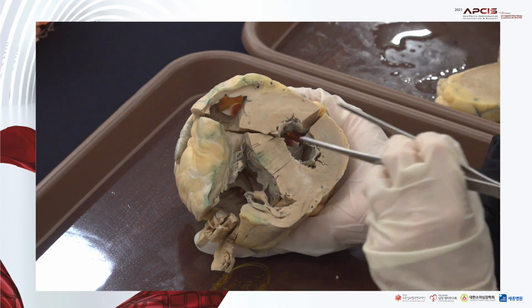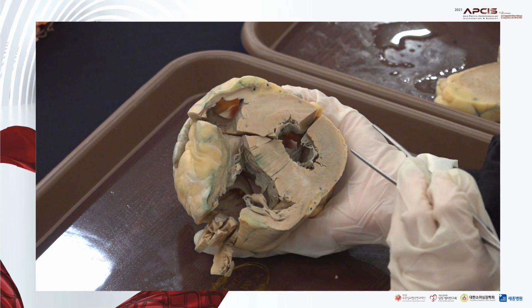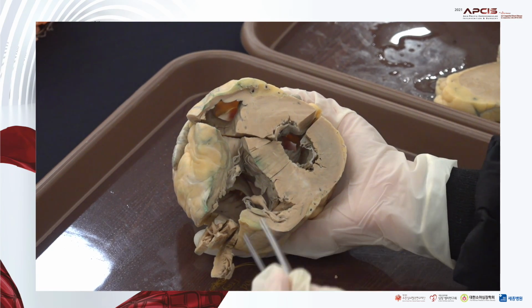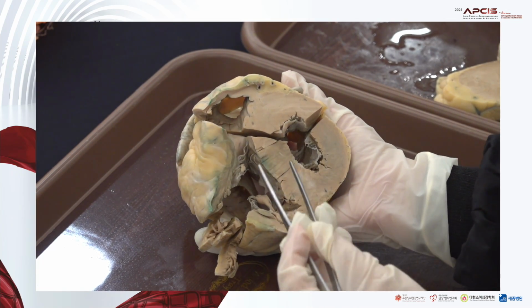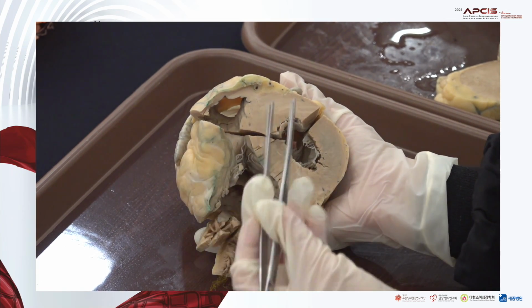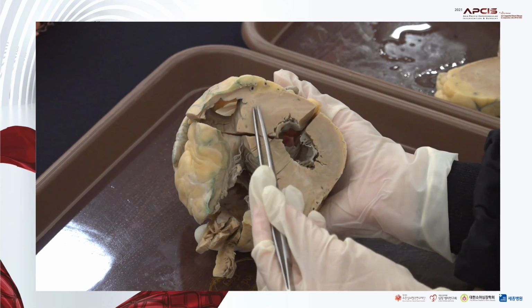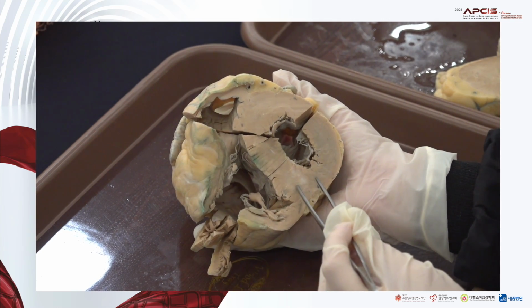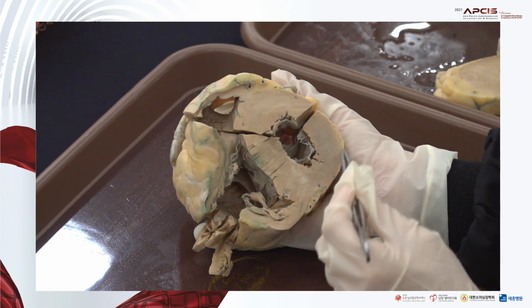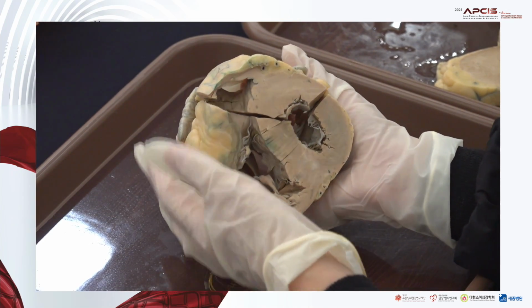Hypertrophy of left ventricular wall is not as thick as the previous one, but this one also shows thickening of myocardium of anterior wall of the left ventricle and the septal portion compared to lateral part of the left ventricular wall.